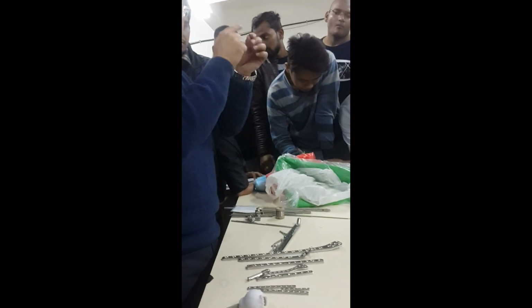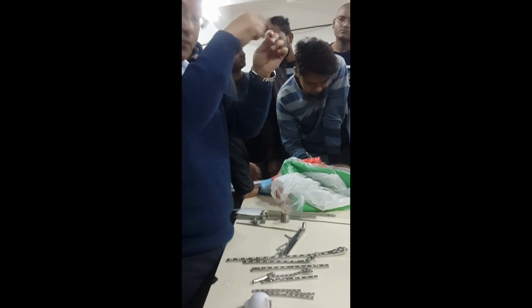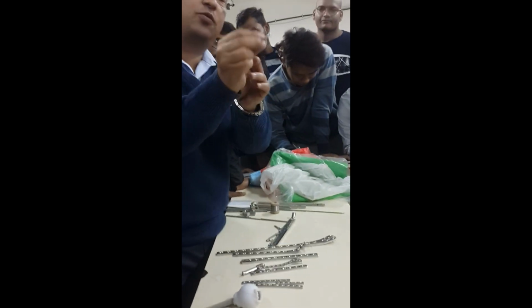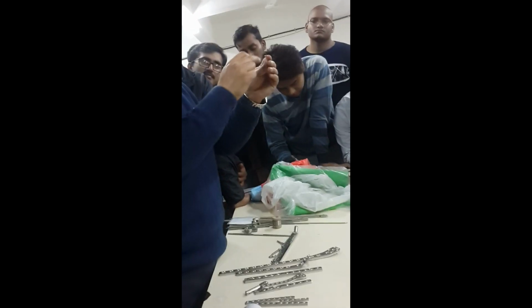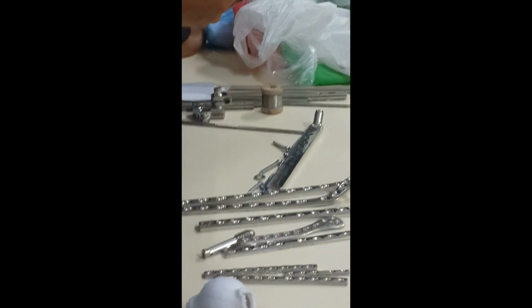Cortical screw. And if you look at the head of the screw, as I told you, it is hexagonal. Your normal household screw is not like this, the 3-sided or 4-sided kind that the carpenter uses. It is just hexagonal. Okay? So the diameter, I will tell you again shortly.